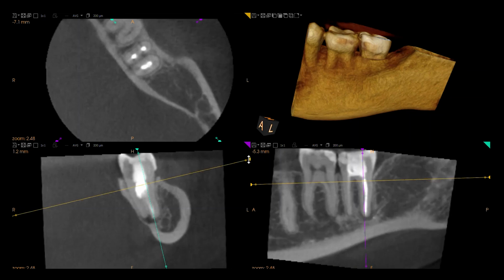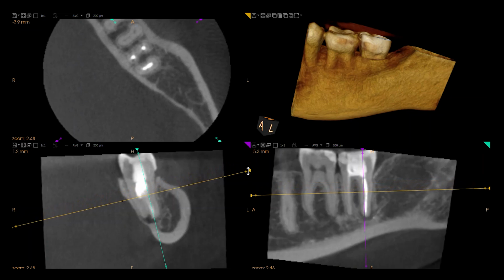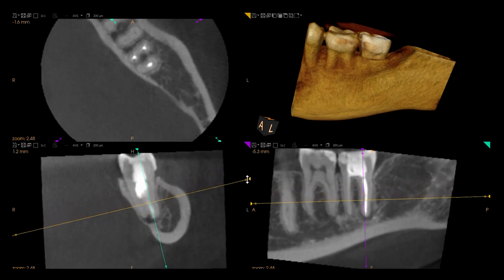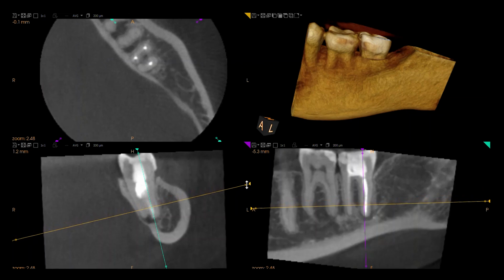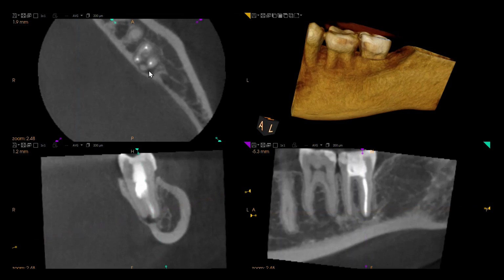But if we go a little bit further, you will watch the lingual canal bud off. The lingual root will actually come off right about here. And we'll start to see the invagination right in this area and in this area, coincident with the area of radiolucency. And there it is. There's the separate root at this level. Very, very close to the end of the tooth.